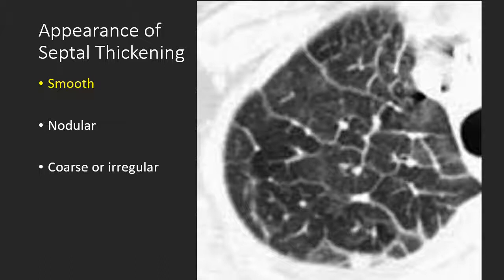This is a CT in lung axial window settings, and we can see that there are these lines within the lung. These long lines within the lung represent areas of interlobular septal thickening. And we can see how these lines can outline the edges of a secondary pulmonary lobule. You can see that in the center of the secondary pulmonary lobule, this dot is the artery that we had just talked about. And we can see how the edges now are being outlined by interlobular septal thickening. The septum that surrounds the secondary pulmonary lobule is thickened.